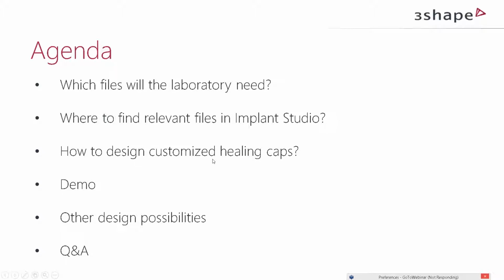Then I will also show you how to design customized healing caps, and for that I prepared a live demo case. I will also show you the other design possibilities, since the principle of creating a file and determining the whole restoration will be very similar, not only for customized healing abutments. Depending on the confidence of each of the parties, we can use it for making customized abutments, temporary restorations, or maybe even a final restoration if you want to go that far.